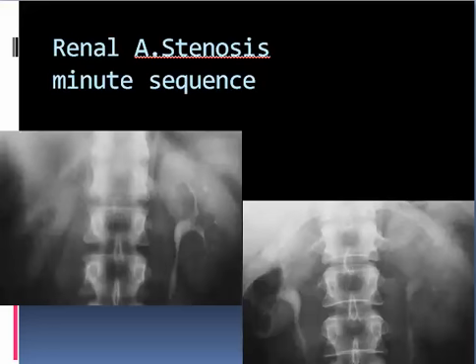Now, what is this? This is an image showing delayed excretion and diminished pyelographic density as well as reduced nephrographic density, and the kidney as a whole is smaller than the kidney on the other side. The first impression could be underperfusion of the kidney, and this means that the renal artery may be stenosed. So what to do?